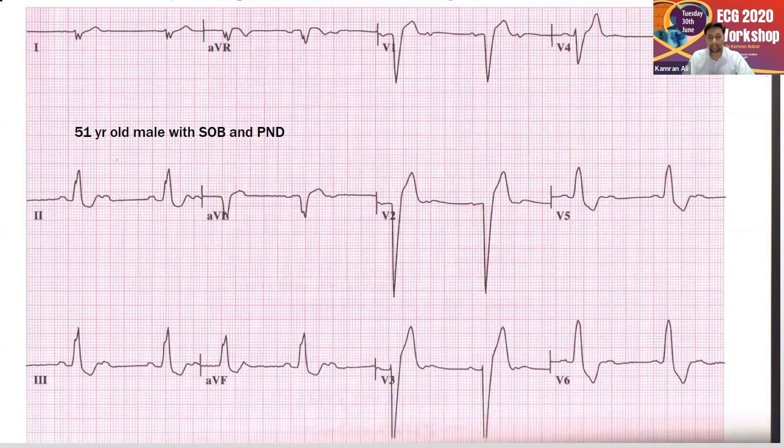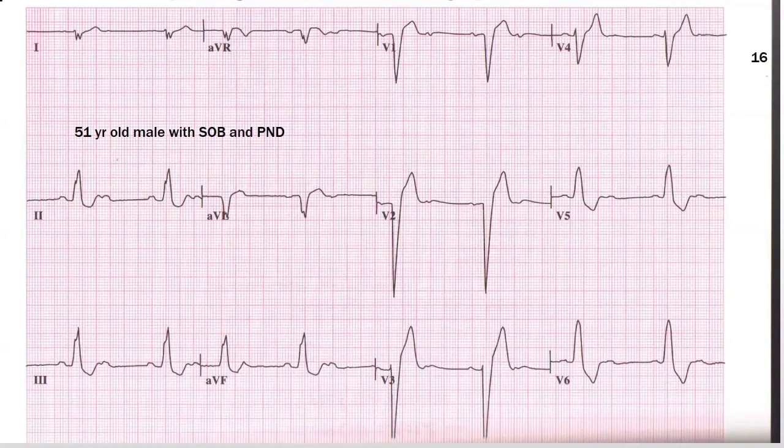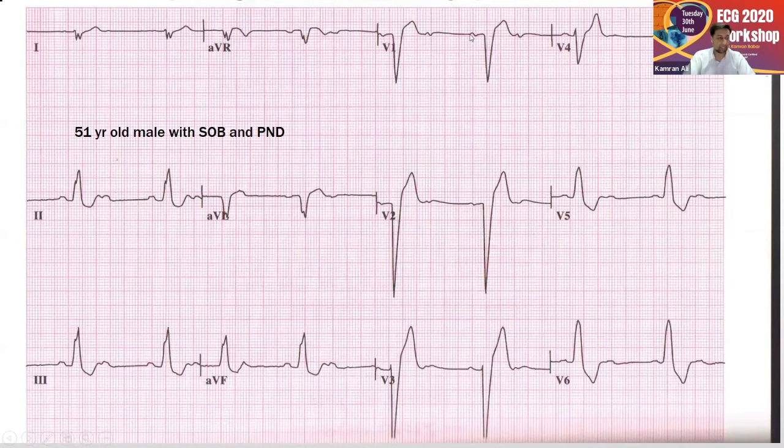So what do we see here? Sinus rhythm, right? So there is a P wave right here, another P wave right here. So there's 2-to-1 block going on. One is conducted and the other one is unconducted. The PR interval is more or less the same in which there is conduction.